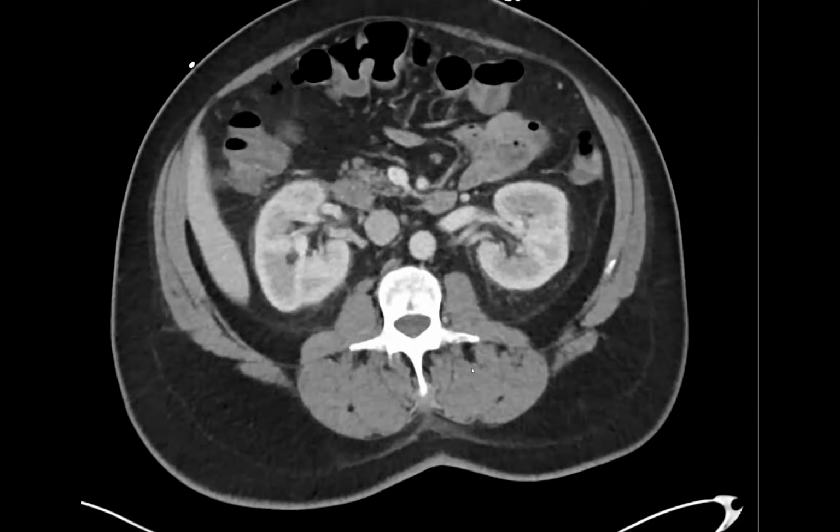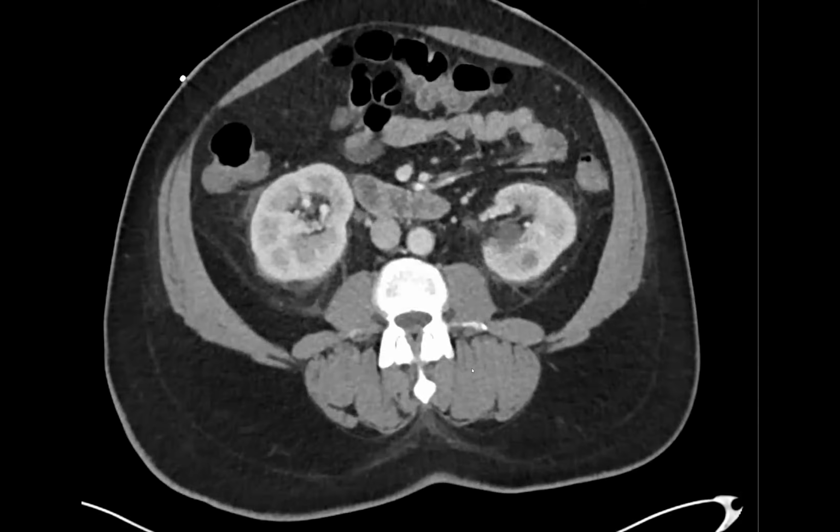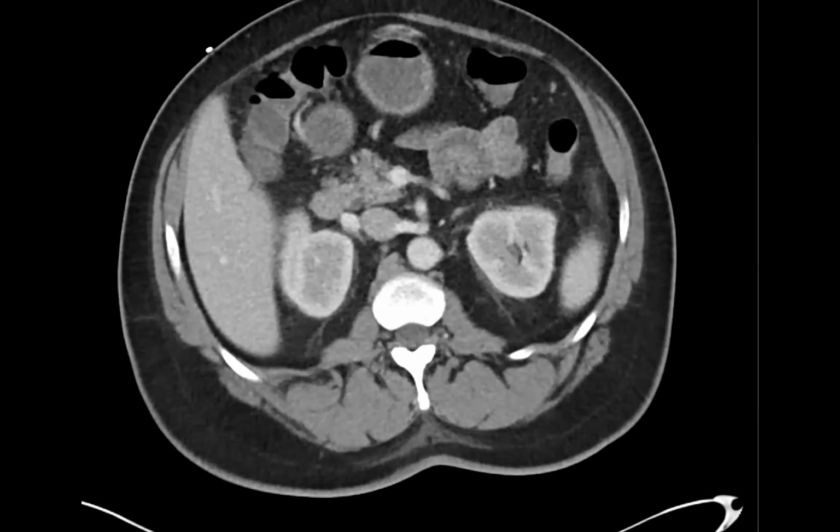That's good. It behaves like lymphoma elsewhere, right? Yep. Did they get a PET? Let me see. We did multiple, so let me try to find the appropriate one. You want to see if the ascites was hot? Okay. No promises here, but hold on. Oh, this is after. We don't have any PET from when they had it, we only have after it's gone. Sorry.